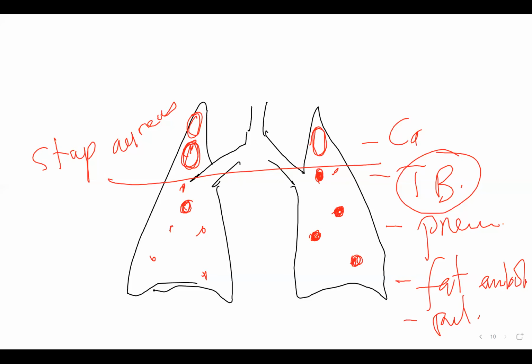Okay. Now in Klebsiella pneumonia, the walls of the cavities are usually irregular. Sorry, for TB, we said they are upper lobe and they are bigger cavities. They are thin-lined, not thick. They are thinner. Okay. Now you see Klebsiella pneumonia.